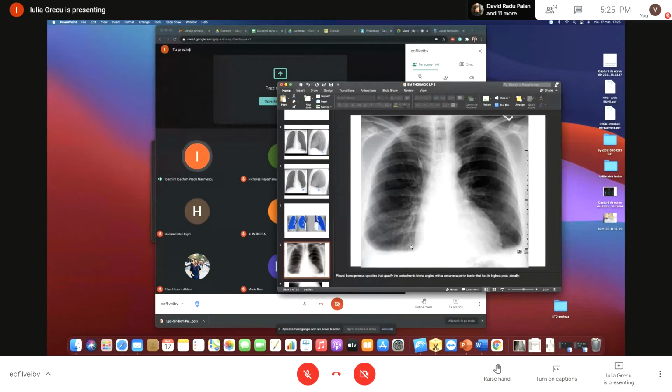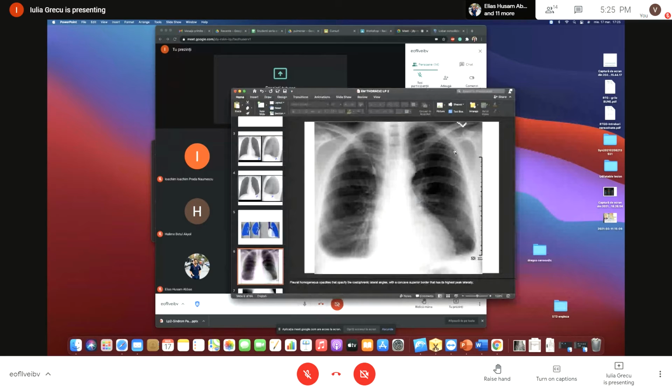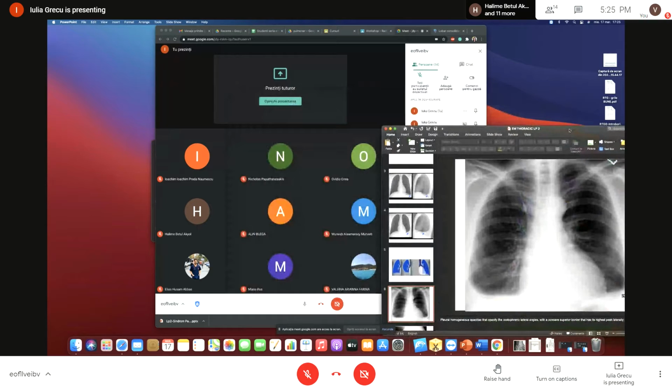No, I have no idea what that is. Someone else knows? So nobody. Yes, please. Is it a stent? A stent. Where? Ovidio. Yeah, I'm not sure.